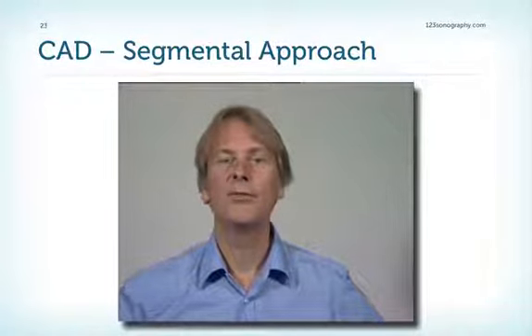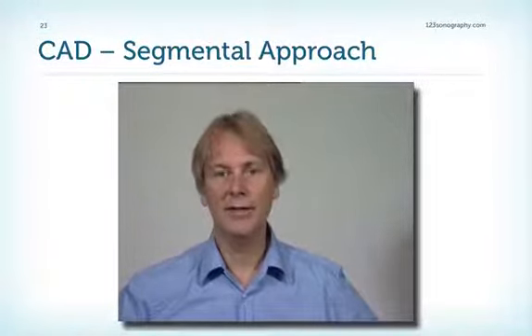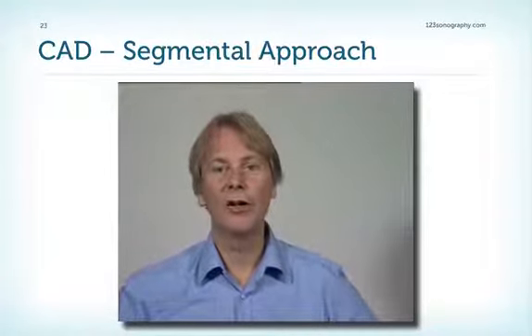So this is how we would perform segmentation of the ventricle. I know this all sounds pretty complicated and difficult to remember, but don't worry, you'll see plenty of examples, and I'll always come back to the segments and repeat them again and again, and I'm sure in the end it'll stick.